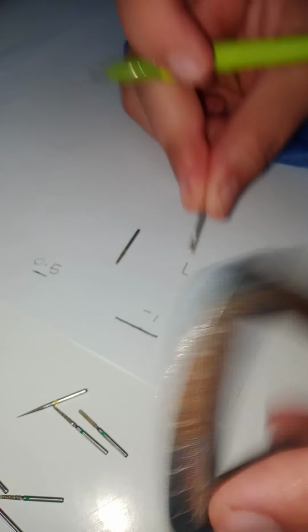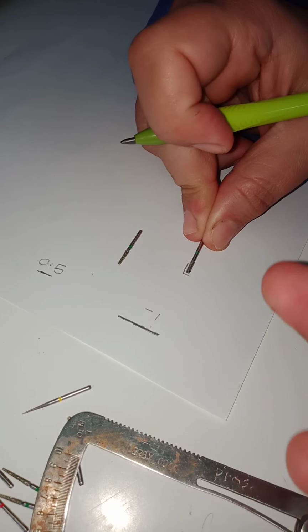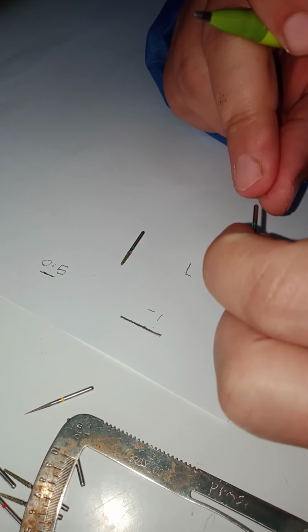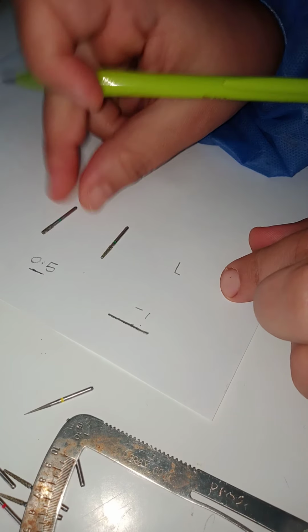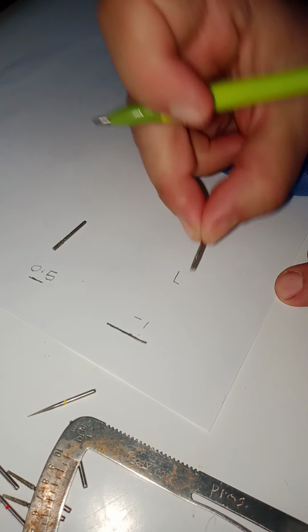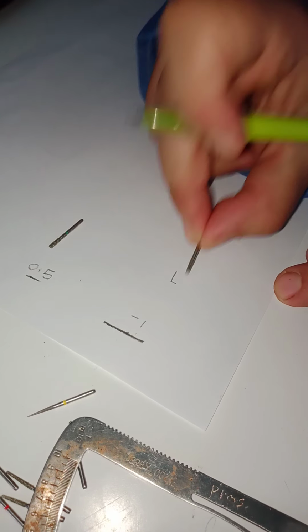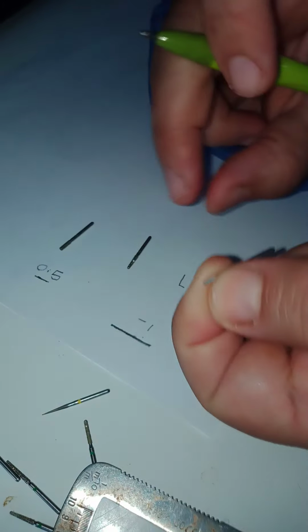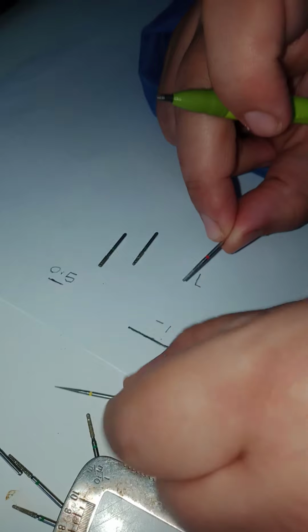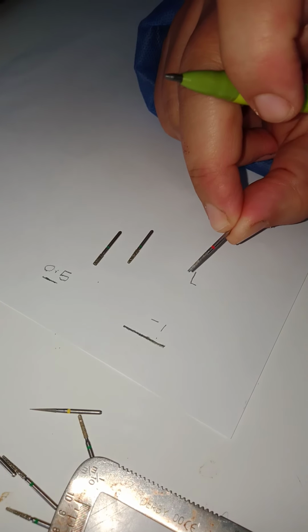So if I'm using this bur to create the shoulder and all of it is inside the tooth, that means I'm in 1.5. Okay, so the bur itself can gauge. But if you're a student and you don't have enough experience with the 1 millimeter bur, go and do your finish line, and then go to the actual depth using smoother burs, using the yellow or red color burs that have a shoulder morphology.